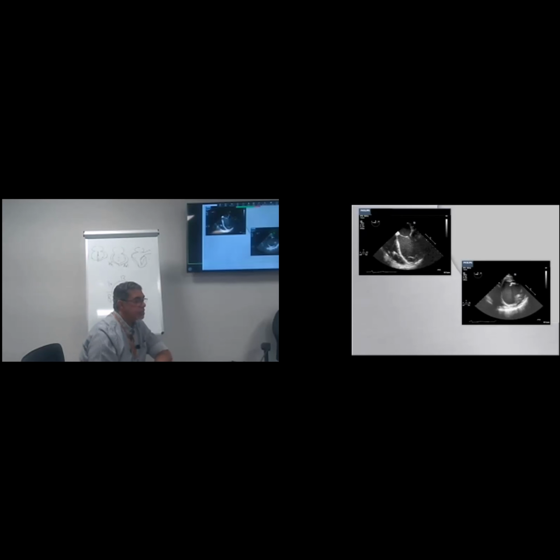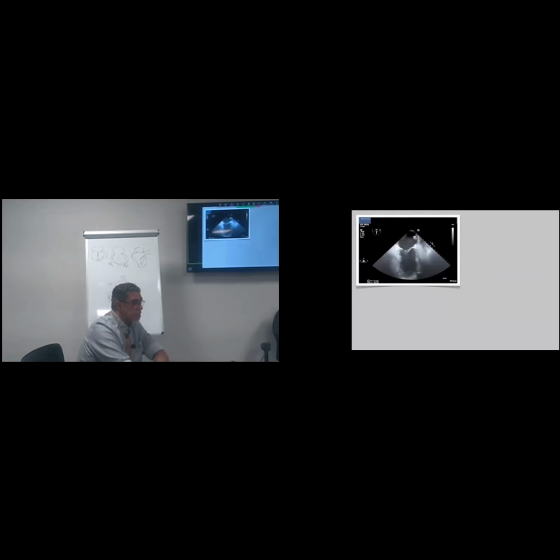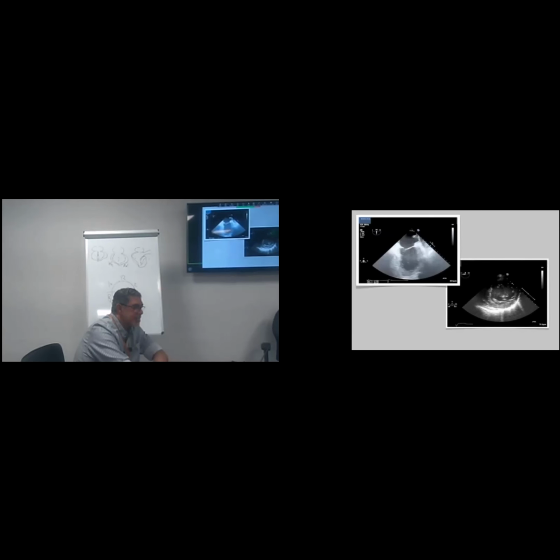The advantage of this slide is that it shows what we are saying. We need to take the longitudinal and the short axis. Don't comment on only the short axis. You need to comment on two views. We said don't comment.